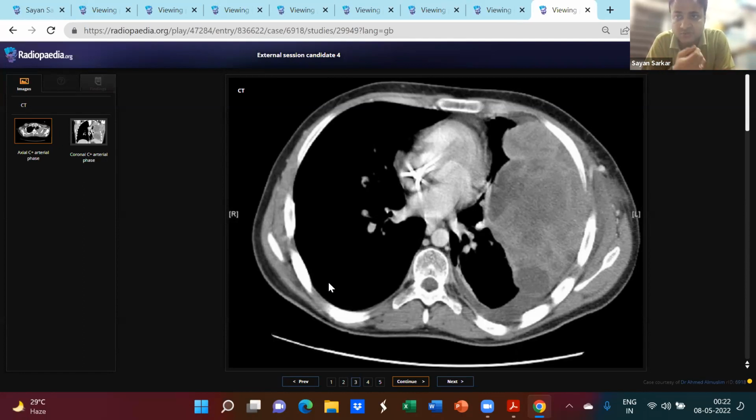What is the exact thing that you're looking at when you're sampling it? While sampling a lesion in ultrasound guidance, you are looking for the part that is most solid looking. Yeah, I totally get your point. In this lesion, do you think there is any fluid component? A few parts posteriorly seem to be of fluid density, but obviously you can ignore that. Well, mostly the lesion is solid.